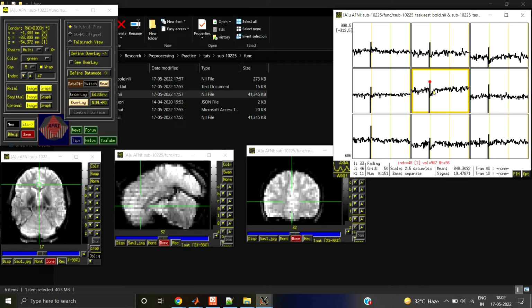You see, it is only the voxels that are changing. This whole volume is not going up. You can see that. So this is the realignment output that we have got, and then things are okay. After realignment, you can see that all the motion changes will be gone, but still this is again an artifact which can cause problems while analyzing the particular data.